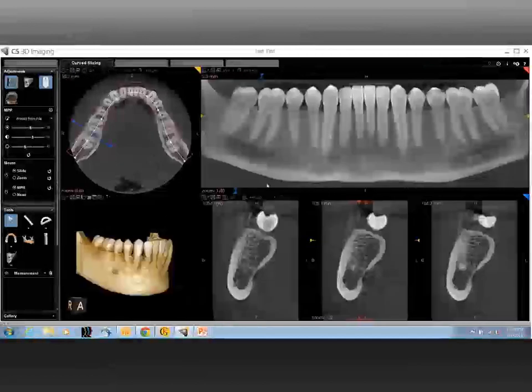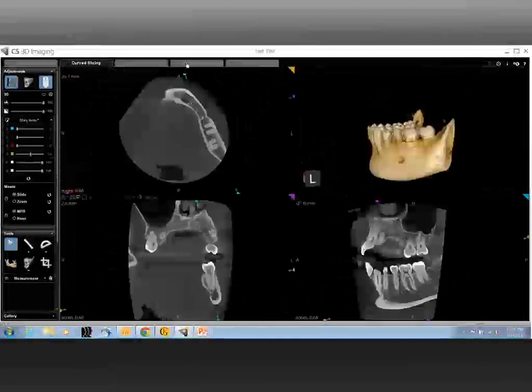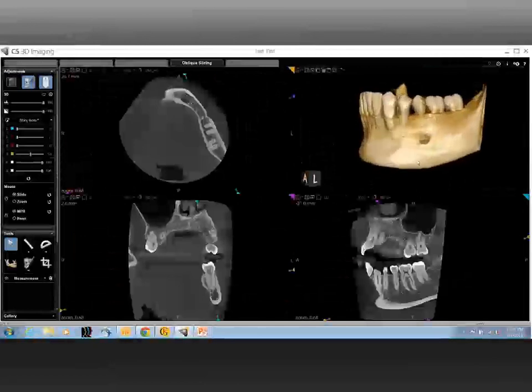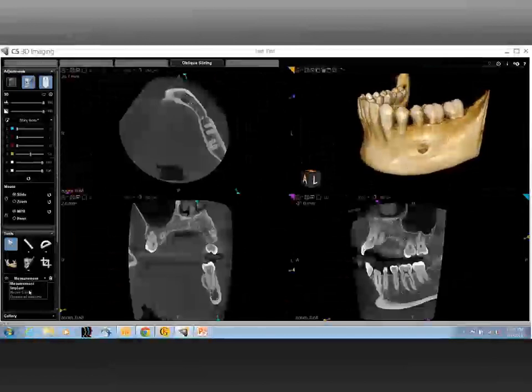That's a good question. As an extension to the previous answer, once all those things are evaluated, the angulation of the ridge, the lingual undercut, and the morphology of the ridge may have nothing to do with endodontics, but the inferior alveolar nerve and the foramen do have a critical role to play. Now, specifically to endodontics, canals.